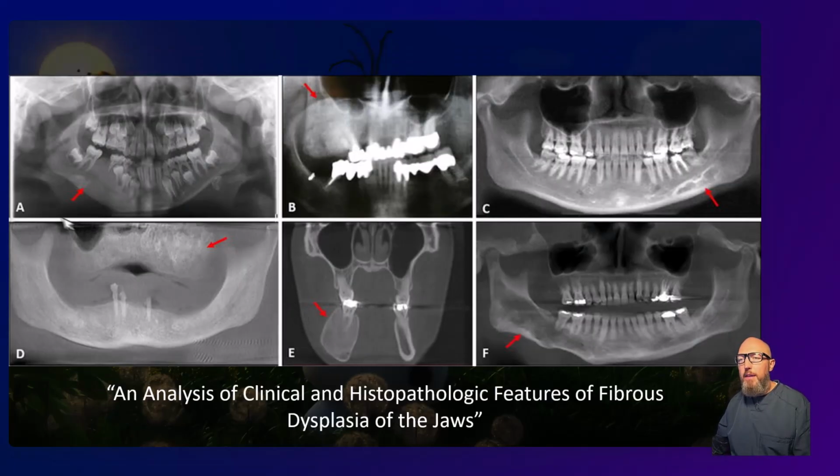All right, what was the pathognomonic sign here in A? See the superior displacement of the canal? First thing you should think is fibrous dysplasia. All the bone through here, though, it looks ground glass. It's expanding in that fibrous dysplasia pattern. All right, how about image B here? Remember filling up the sinus with that moderate gray. Also the kind of ground glass, or maybe it's more the cotton wool appearance of the maxilla here. All of that is fibrous dysplasia.